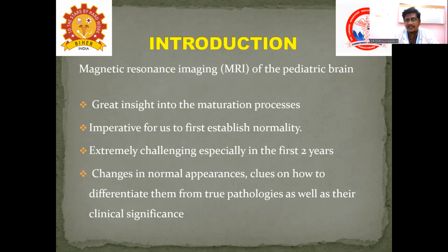is the development of the pediatric brain, and how it helps in identifying insult to the brain, such as hypoxic-ischemic encephalopathy or periventricular leukomalacia changes. Whenever there is an insult to the brain, there will be decreased blood supply and decreased oxygen, which results in decreased development of the particular area, which results in softening of the white matter, and we call it leukomalacia, and it also goes on to encephalopathy. Different types of changes will be there that we call encephalopathy.